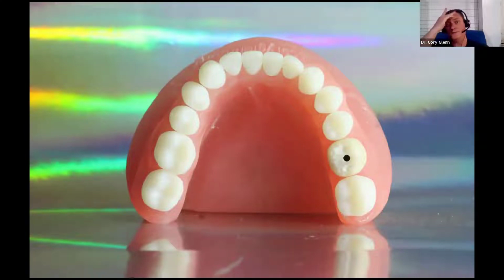Typically, what we do is we bury it, and then we do a second stage surgery, and we put on a healing abutment, and no one's stock healing abutment is shaped anything like a natural tooth. So it ends up healing to this perfect cylinder. And then your crown ends up having that cylindrical shape too, because it's just a backward workflow. A far better way to do this is to design the final restoration while they're healing with the gingiva covering it.